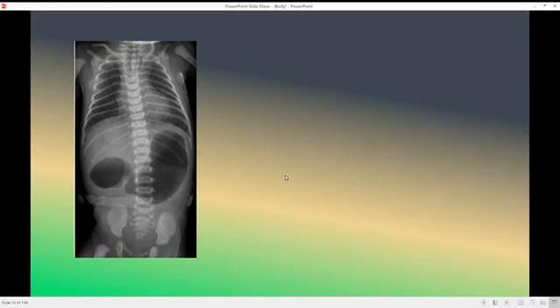Okay, now we receive some answers. This patient has two pathologies, as we see here. We have a double bubble sign due to duodenal atresia, and also the NG tube is not passing the pharyngeal pouch above the esophagus. It is stuck there and dilated above the esophagus, and this is also an esophageal atresia with fistula. So this is duodenal atresia and esophageal fistula with atresia.